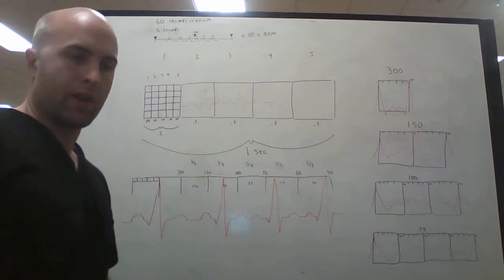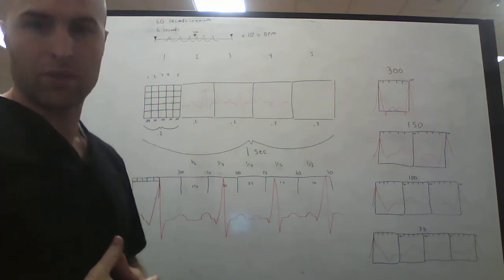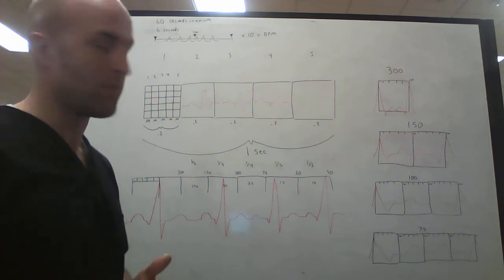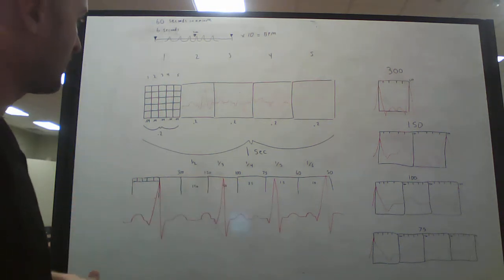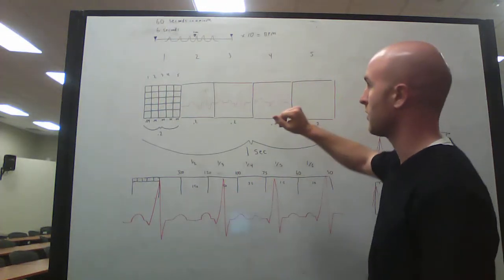This is for electrocardiogram. Really quickly, fulfilling objective 10, which is to demonstrate and know how to determine various time measurement calculations using the ECG paper graph markings. Starting out here, we're just going to show a couple different methods of how to do this very quickly, very simply. This is just dealing with the time, not the volts.